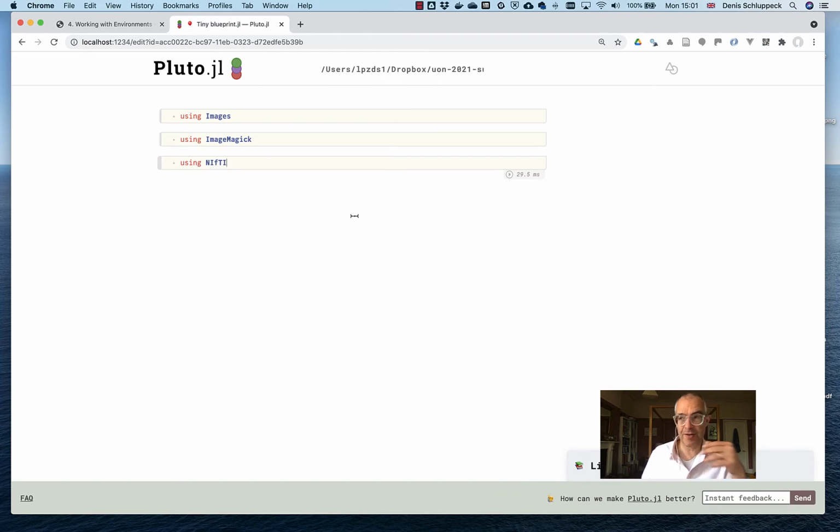So the next thing we want to do is load in this data file that contains the images. Now they're not images like you can open up in Photoshop or some other image viewing program like on your phone camera or something. They're stored in a special format that's used for scientific images, for brain images. And so we're going to use this function that was included in this NIfTI library to open up the files. And then I will show you how you can actually display the numbers that are stored in that file as an image that we can sort of understand with our eyes.